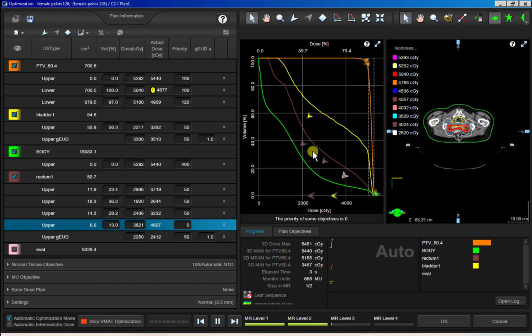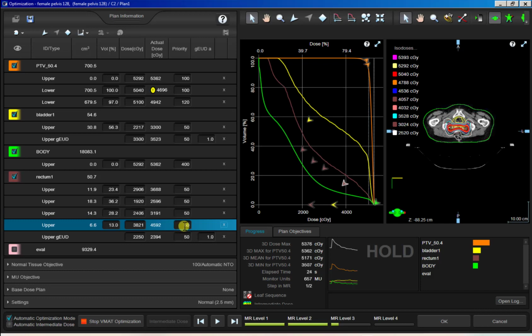So I think 8% at 50 is a bit of a stretch, right? Just based on evaluating our plan. I think the 4,000 to 15% maybe we can get a little bit closer, right? But still going to be tough. So I'm going to pause it. Oh, I forgot to put a number in here. So I start with 50, right?